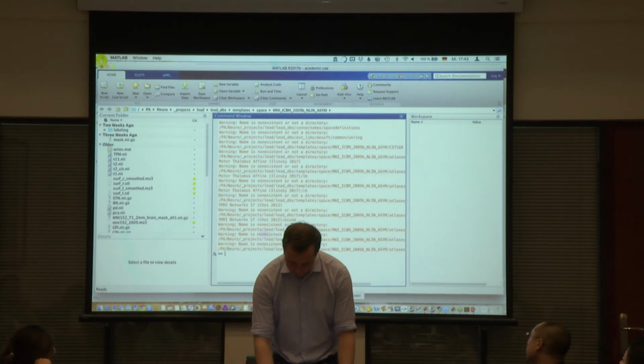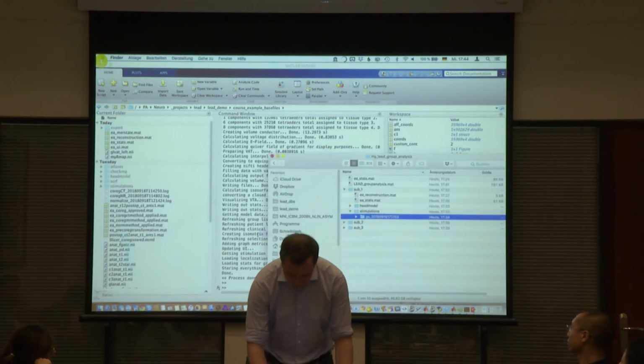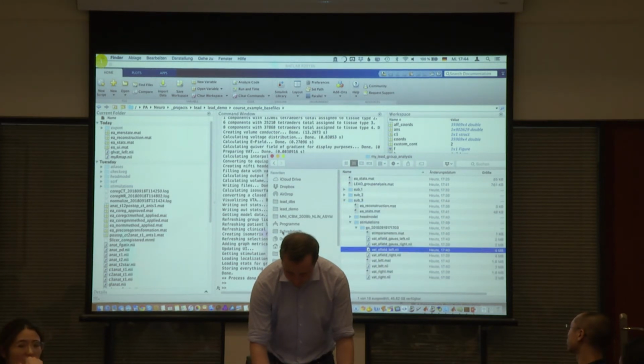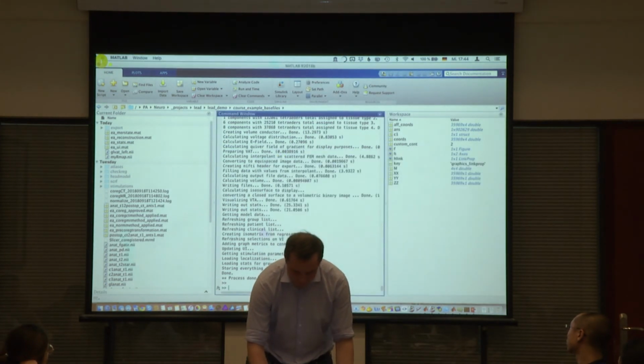And let's see how far we are. The process is done, sounds good. Okay. Right, so now, as you can see, for each patient we have mapped the VTA, right? Everything. Now we can try it, and I hope it works.